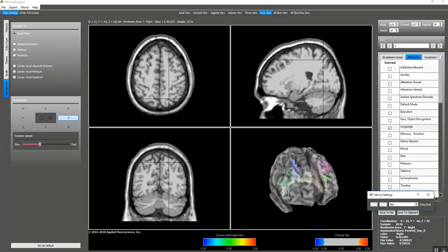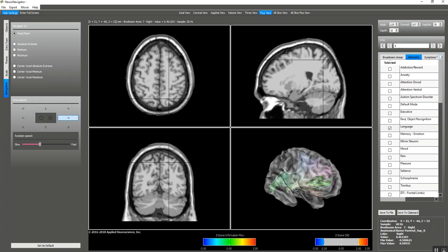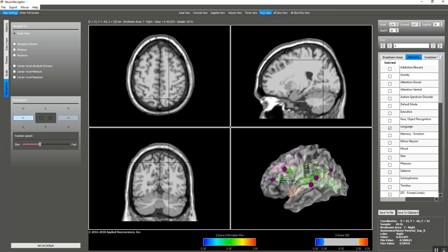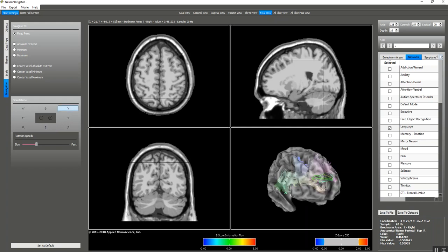You can click stop, but it's a good way to get a quick view of which regions of the brain are deviant from normal as a link to the patient's symptoms. You can also get different orientations if you wish with this control. You can control the speed at which your mouse will move the objects or the views.